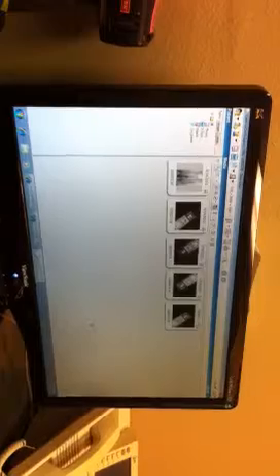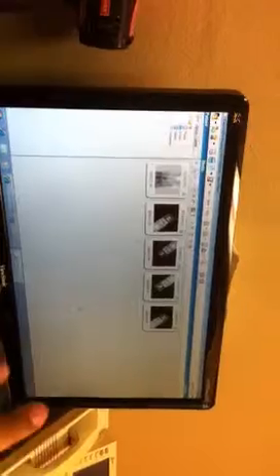One thing you have to remember, whenever you import something into Visora, it's permanent. It's not going anywhere. So do not be afraid of working on the system. There's no save button anywhere in the software. You don't have to save anything while you're working. So if you're working and the power goes out or the computer crashes, you're in the middle of something, don't worry about that. It automatically saves as you go along.